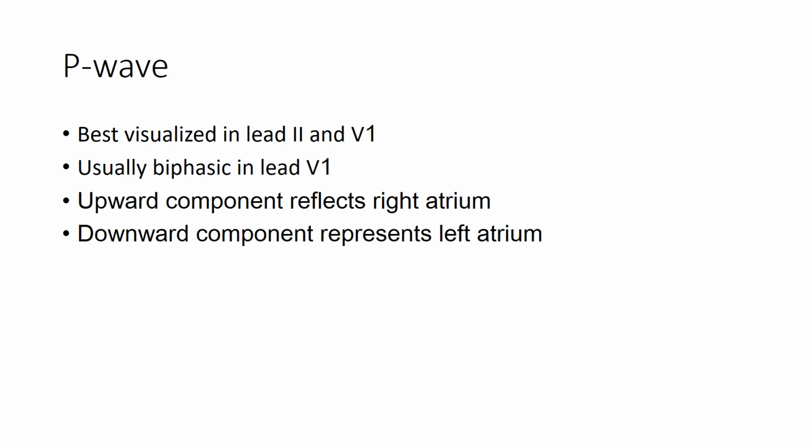the mean cardiac vector is directed downwards and leftwards, and we have also discussed that when the current flow is parallel to the direction of a bipolar limb lead, then that bipolar lead records the maximum positive deflection. So as the direction of flow of current and the lead 2 are in the same direction or almost parallel, so lead 2 shows P waves the best.